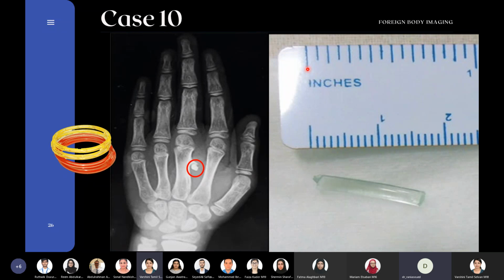It's gradient echo. Gradient echo can see metal clips or any subtle foreign bodies. Of course, if the foreign body is big, like in MRIs of the brain of people with braces, for example, or dental work, you have a lot of artifact. The MRI is not going to be good. But if we're talking about something very, very tiny, then you could see it on gradient. We're talking about very microscopic, tiny foreign bodies.